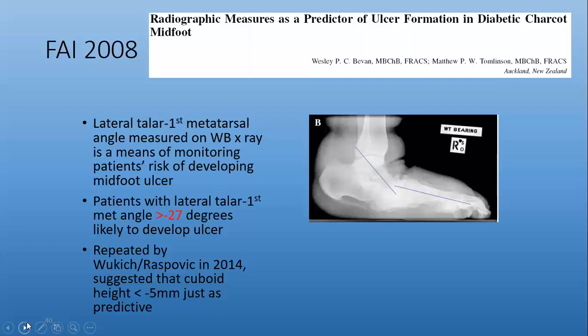I guess I will. Oh, go ahead. Okie dokie. All right, it looks like it's a lateral view of the right foot, and looks like there's sclerosis and coalescing going on in the midfoot. Okay. Possibly some hammer toes. Sure.